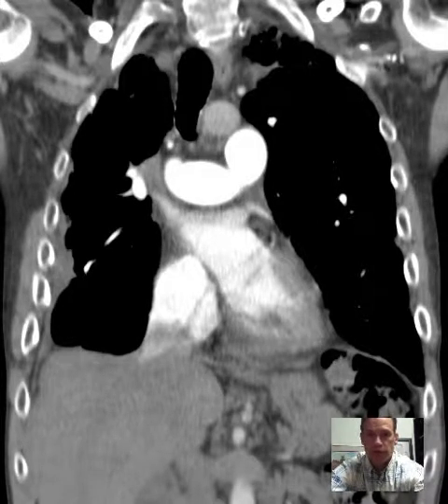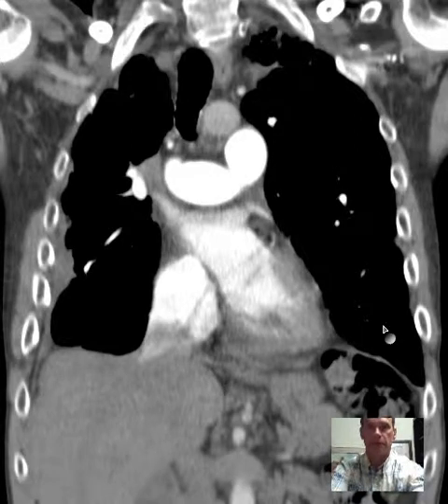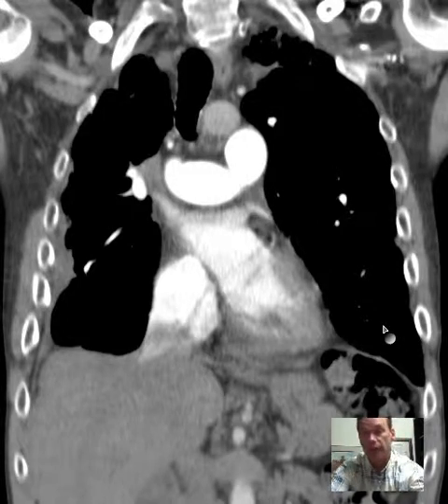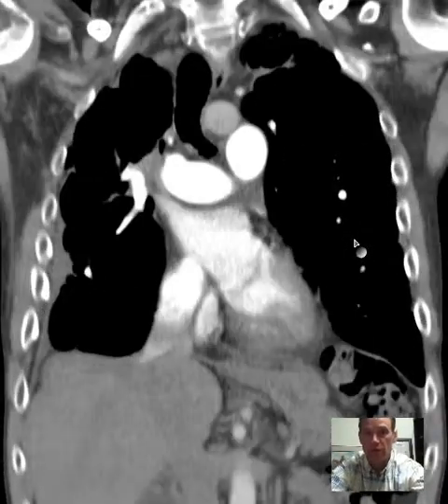This is a case of a patient with shortness of breath, and it prompted a pulmonary embolism CT to be done. Truth is, it doesn't require a whole lot of prompting to get a pulmonary embolism CT done. It is the feeling of some radiologists that it is vastly overused, but that's another subject. Just to kind of give you a heads up about that. Maybe you've heard it, or maybe you have not.